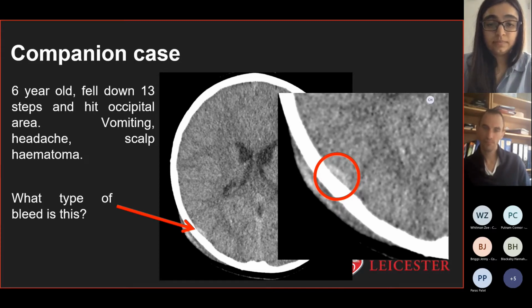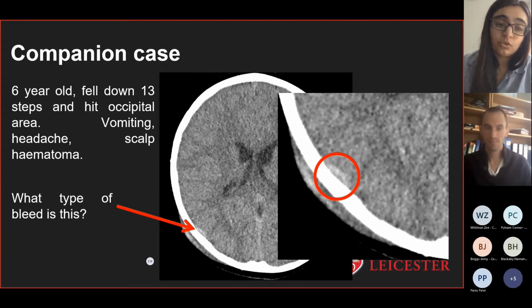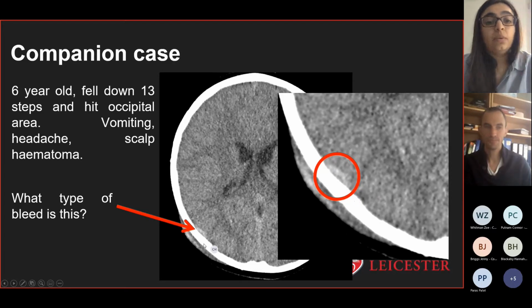Tabarak, this one, or? Any other ideas? Or still epidural? Yeah, fantastic. So it's an extradural as well. So you've got your biconvex shape, and that gives it away.